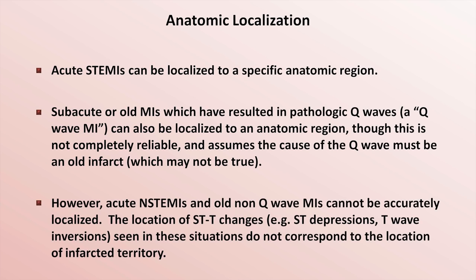However, acute NSTEMIs and old non-Q wave MIs cannot be accurately localized. That's because the location of ST depression and T wave inversions seen in these situations do not correspond to the location of infarcted territory.